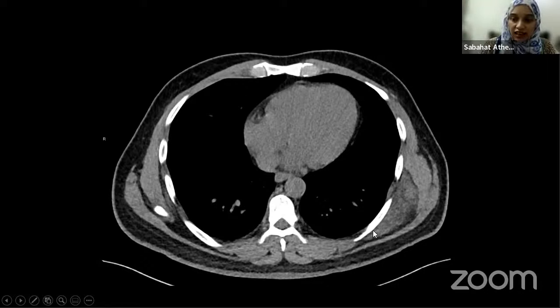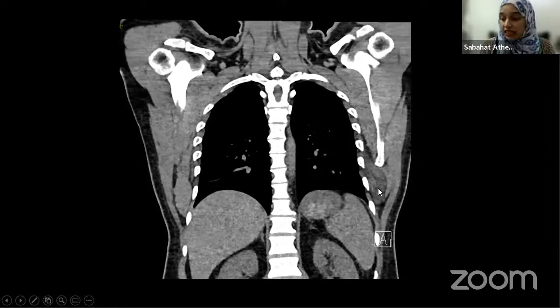And you can see a large soft tissue density here, and if you look on the other side, you will see a faint soft tissue density here as well. So this is bilateral, very large on the left side. It is deep to the serratus anterior and the latissimus dorsi. It is infrascapular, as people said. This is elastofibroma dorsi. And once it's in a typical location with typical appearance, there is no other diagnosis for it. Okay, it's like the Aunt Minnie.